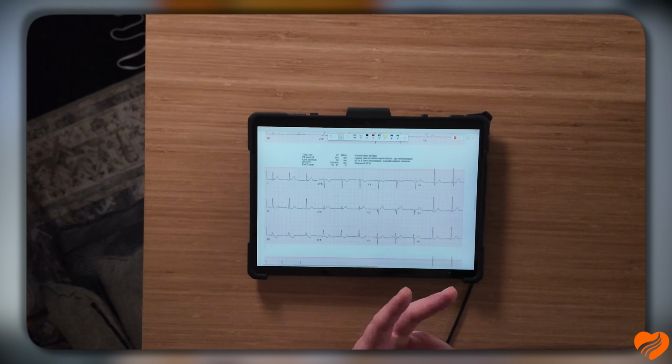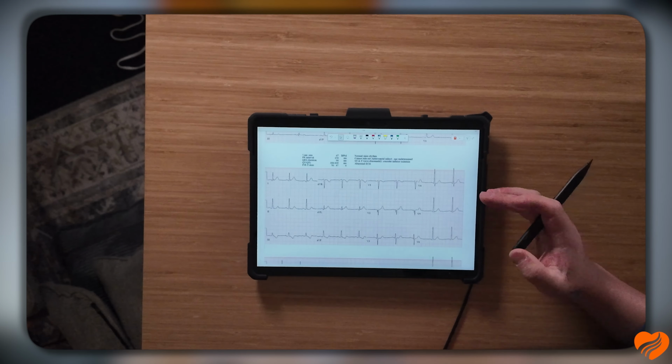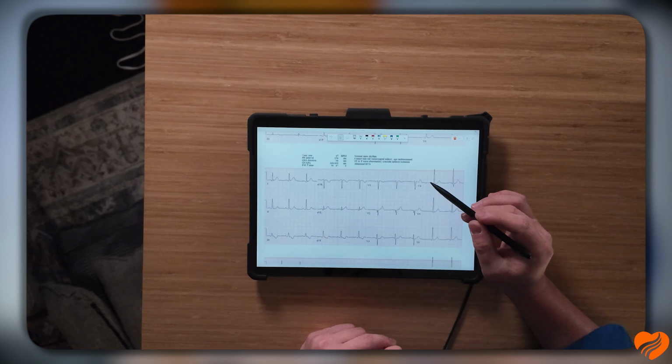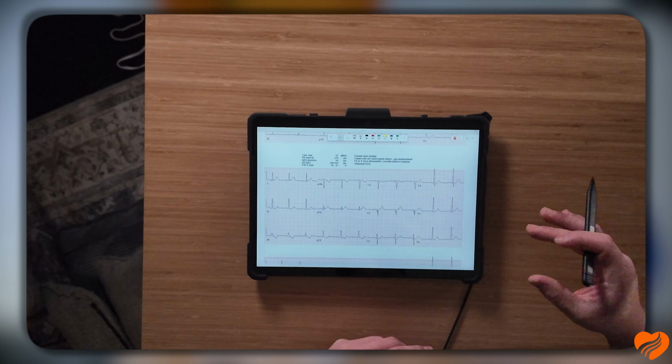Now, but we're good clinicians, right? We walked him to the aircraft, he's all snuggled up, no big deal, but we're gonna redo our 12 lead, right? Because this is a very dynamic situation. Okay? So, let's say we're mid-flight, okay? We took another 12 lead. Now look at the difference, right?